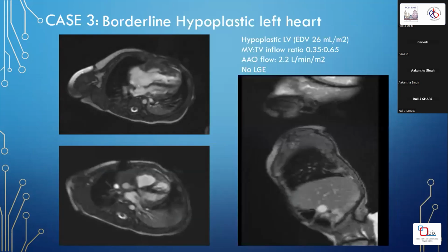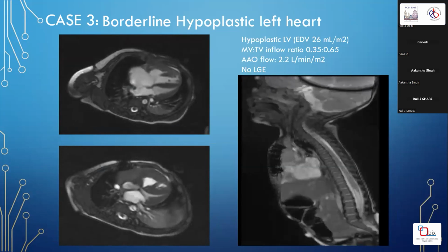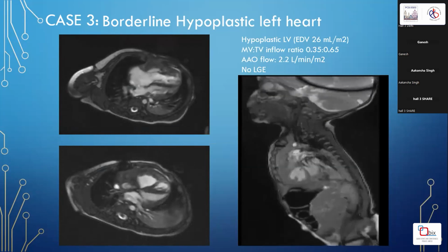A very common indication for cardiac MRI in pediatric cardiology is deciding on univentricular versus biventricular surgical routes in borderline hypoplastic left hearts. This was a patient with a complex variant of Shone's, with mitral stenosis, bicuspid aortic valve with a narrowed LVOT, had already had a PDA stenting with bilateral PA banding and a fenestrated ASD closure for LV recruitment.